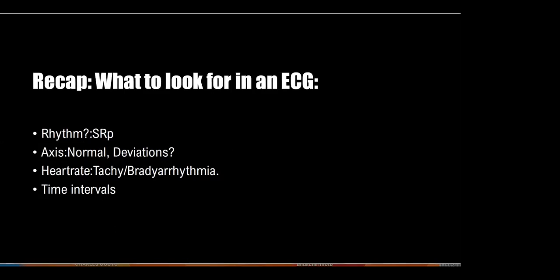First of all, you have to look if your ECG has a P wave, and you have to look that each and every P wave is followed by a QRS complex. So we have an ECG. Right now you can draw, just a minute.